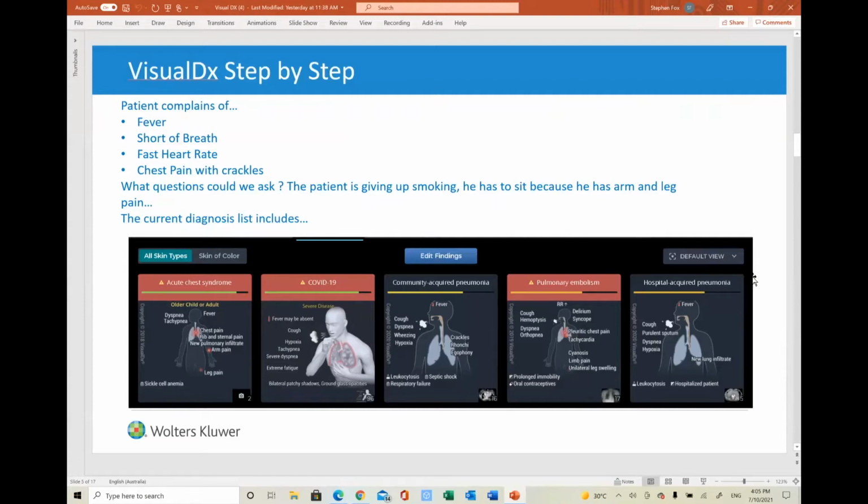So based on this, we can really begin to think, well, what additional questions should I ask? What are the other sorts of observations that I need to make this a firmer diagnosis? One thing that we can also see is that as that colored bar at the top of the summary chain expands, it changes color.